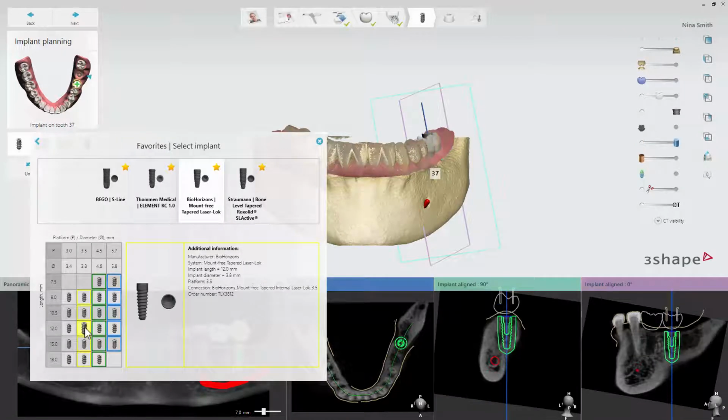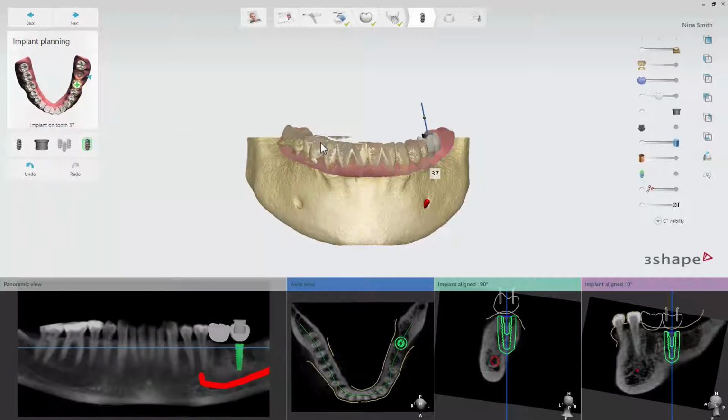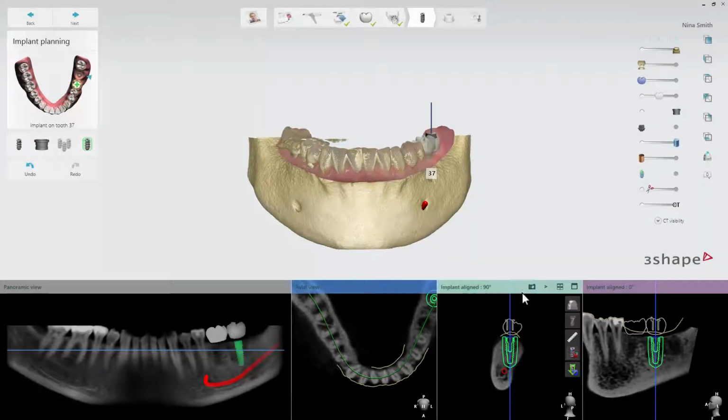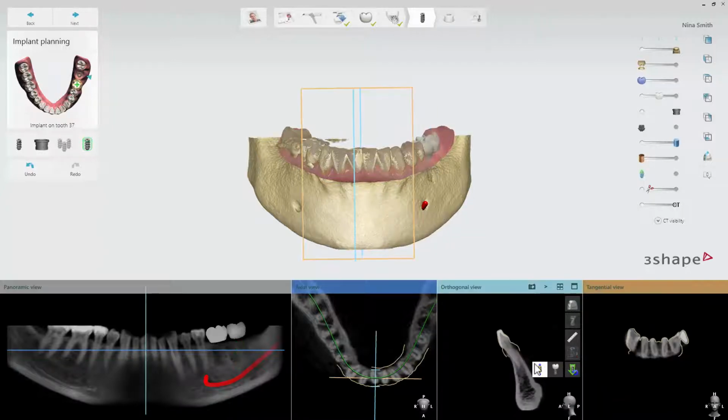If you want to place multiple implants, select another tooth in the indication window and click on the green plus again to add an additional implant. The implant will automatically position itself relative to the virtual crown, which was positioned earlier. In case you have not designed a virtual crown, you can also insert the implant manually. For resetting the implant positions, simply click on the green arrow icon and choose Reset Manually.